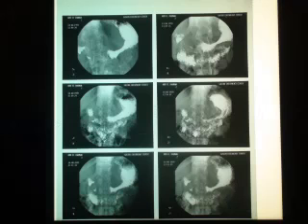Now we can see another barium meal. Here is a part of the stomach with stricture in the gastric antrum, which is mostly a gastric body or antral tumor, leading to destruction of the mucosa, as you see here. So when I comment on this case, I can say that it's a barium meal showing mild dilatation of the stomach with filling defect or tumor effect affecting the body and the antrum of the stomach.